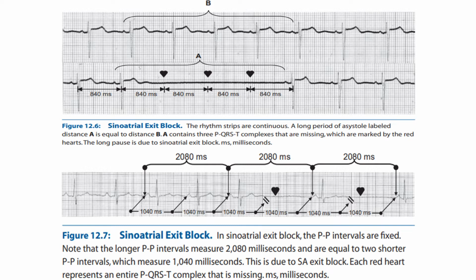And another example, this is a multiple of the same. The sinus pauses remain the same, the PP intervals remain the same. Two PP intervals are equal to one long pause.